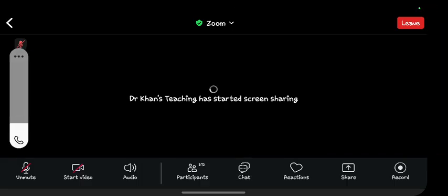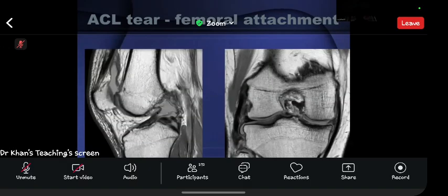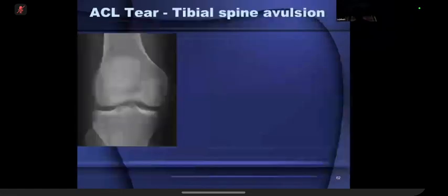Femoral attachment goes, we just see a wavy contour of the ligaments arising from the tibia, but then it's a very horizontal appearance, and you don't see any femoral attachment at all. It's just taken up by fluid, which is present at the site of the normal ligament attachments.